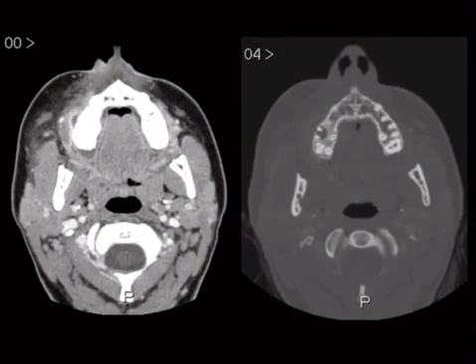All right, another case. This is another odontogenic situation, and this right here alone you may not pick up, but when they show it on the bone window, so bone windows in the head are going to be shown for a couple of reasons. One, to show you lucencies and stuff in the teeth. Two, to show you fractures in a trauma situation. And three, to show you aggressive osseous lesions, which should be obvious. So when it's centered over the teeth, immediately look at the teeth because that's what they're going for.